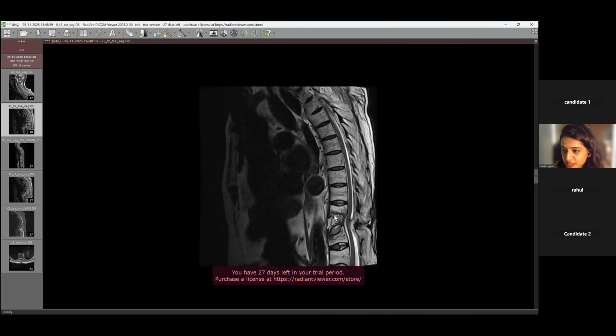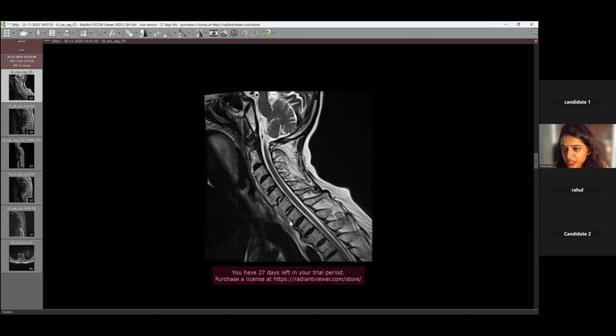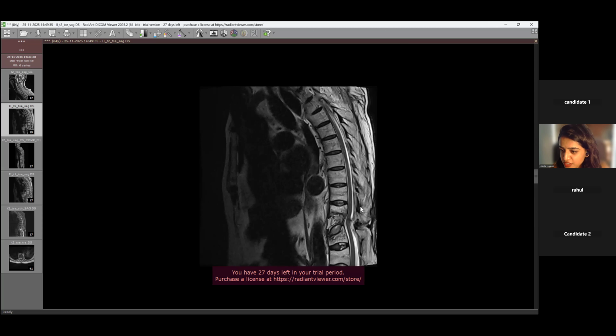So basically, this is the space between the two vertebral bodies. And as she said, this is all the ossification anteriorly, which we are seeing. And through it, we have a carrot stick or chalk stick fracture. I'll just show you the CT of this same patient as well.